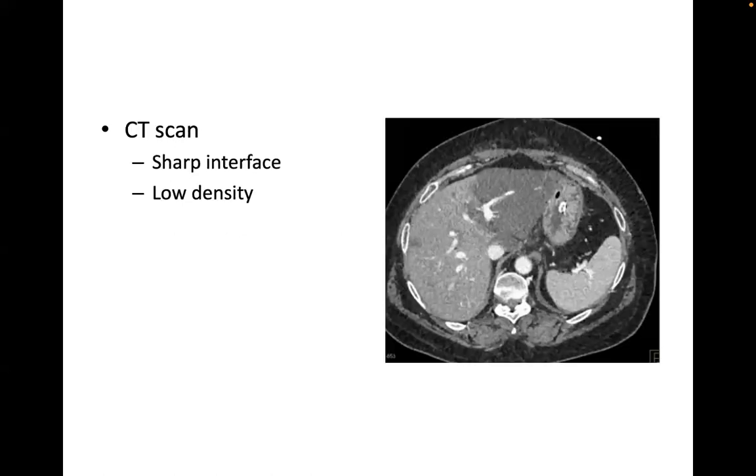And on CT scan, you can see that it's hypodense, of low density, with a sharp interface. That's why I said usually it tells us that there is differential uptake of contrast, and it will go with the blood supply of the contrast, like we see here, that is mainly in segment 2 and 3. If there is no clinical history or any other disease associated with it, you should be able to see that it's a hypodense lesion.